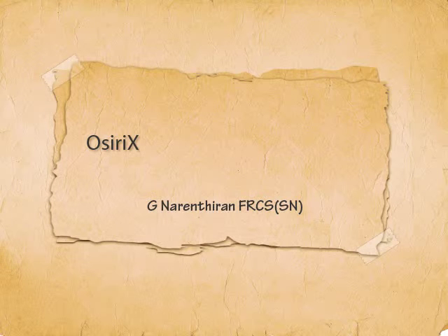In this presentation, I will demonstrate to you how you could use OsiriX along with Photoshop to simulate an operation. This is an overview, and for more detailed instructions, you need to seek out an expert in OsiriX.